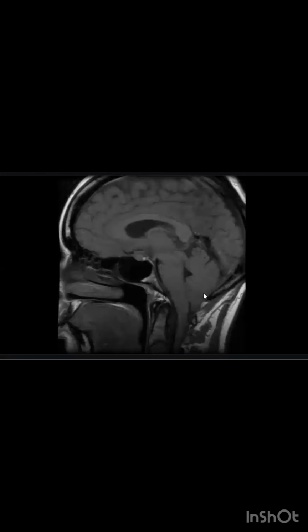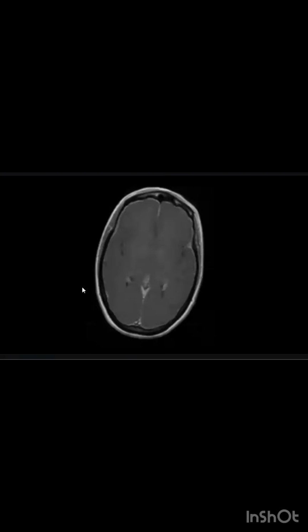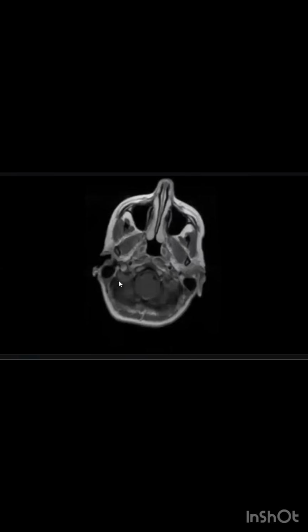You did very well by asking for the sagittal, which confirmed tonsillar ectopia, and also confirmed pituitary engorgement and loss of the angle, with sagging of the midbrain also. The next one will be the post-contrast with diffuse pachymeningeal enhancement, and the case was intracranial hypotension. Intracranial hypotension can be spontaneous primary, with no cause, or secondary.